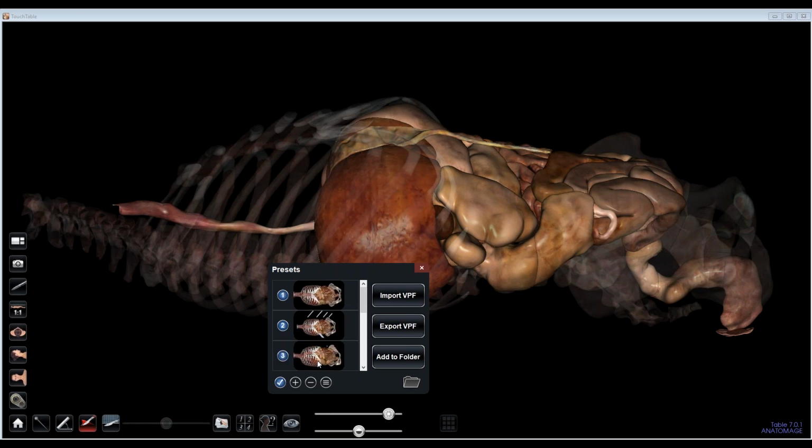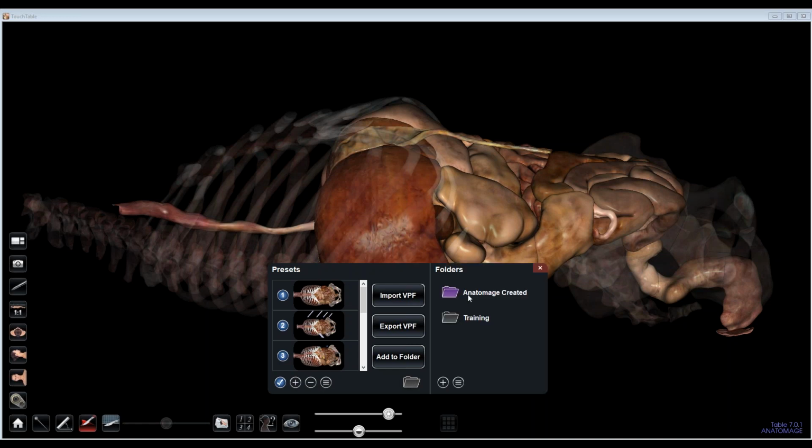If you do want them to stay there for other people to use, then you can absolutely just leave them there. Another thing that you can do is you can just add them to a folder so that you keep this list here clear and clean, and students or other teachers can come in to the folder list and go pick the specific ones that they want.